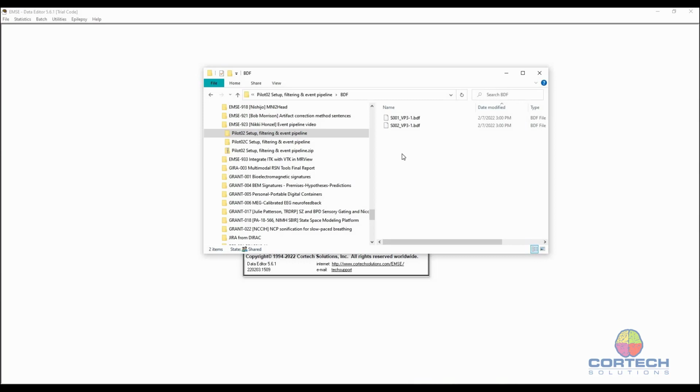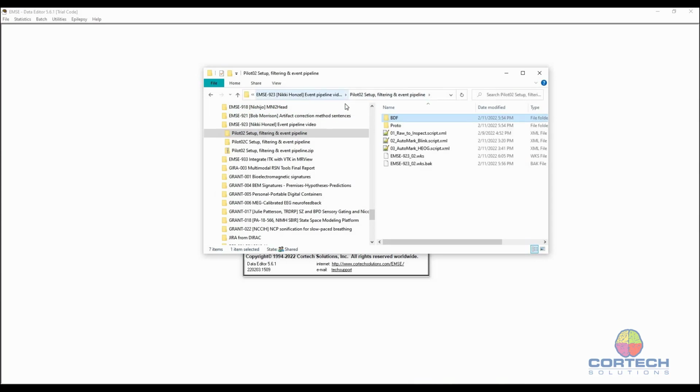took the configuration file that you gave me, and the one that you want to be using going forward, and I changed the channel names in these files to match with the configuration that you're planning to use going forward. So this is our input in this folder called BDF. I'll show you in a bit what's in this proto folder. I'll show you right now what the contents are, and then we'll see in the workspace.